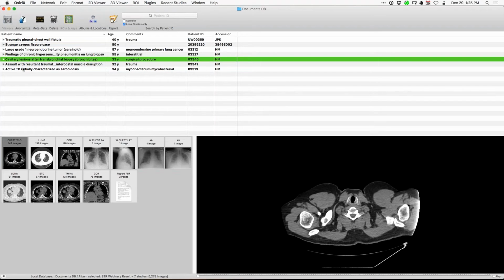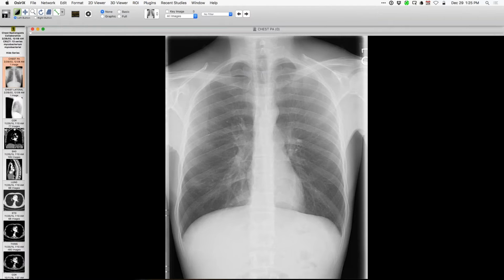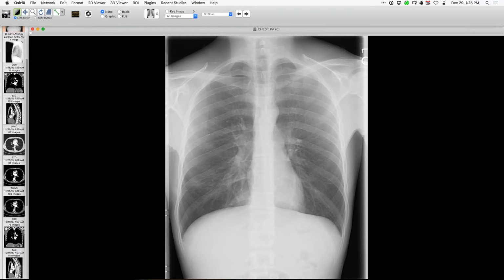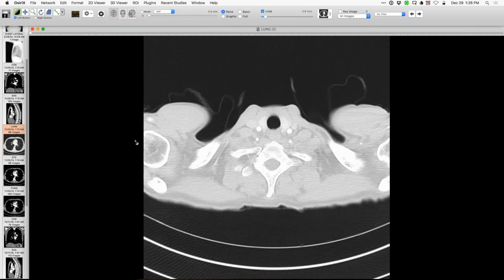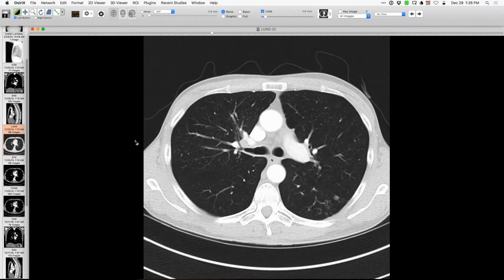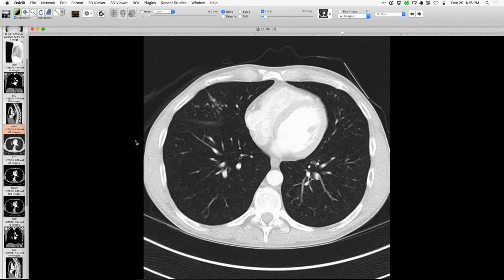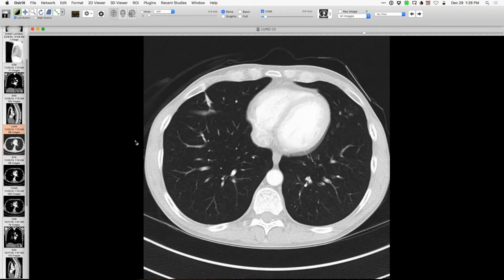Okay, so you've got some bronch bites there. Let me show you this one. This is an exam from, let me make sure I've got the right one. Here we have a person with multifocal multilobular disease. Notice that we have nodules.